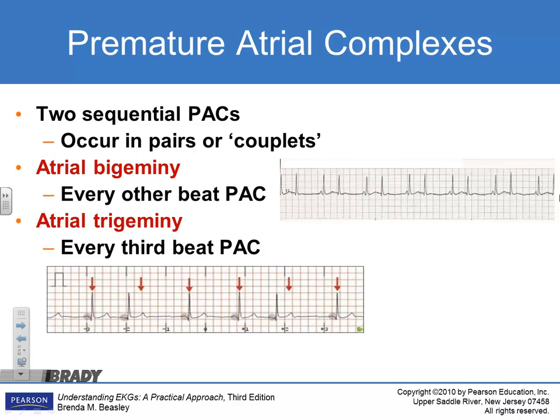If it's every other beat where one has come in, then we've got bigeminy. That means every other one. So this is a normal beat, premature. Normal beat, premature. Normal beat, premature, just like that. So we'll call that bigeminy.